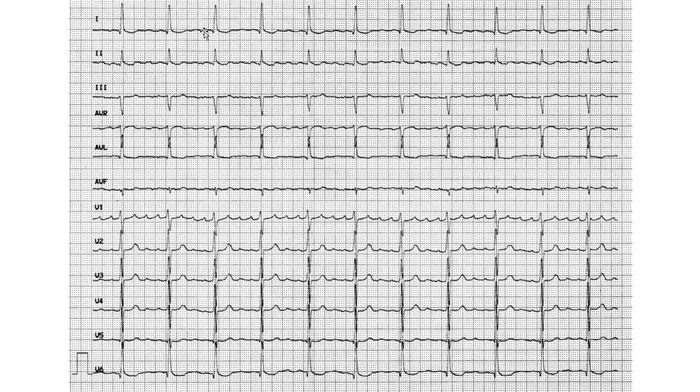Regular, and is it sinus or not? That's point 2. As we go through it, we see something over here. Is it P waves? I can't really say. By the way, don't be too narrow-sighted. Keep your eyes open to the whole ECG, and clearly you see, especially for V1. V1 is very good for information on the P wave and on the presence of flutter or fibrillation. Here we clearly see that there is sawtooth morphology. So off the bat, it is very likely going to be flutter.